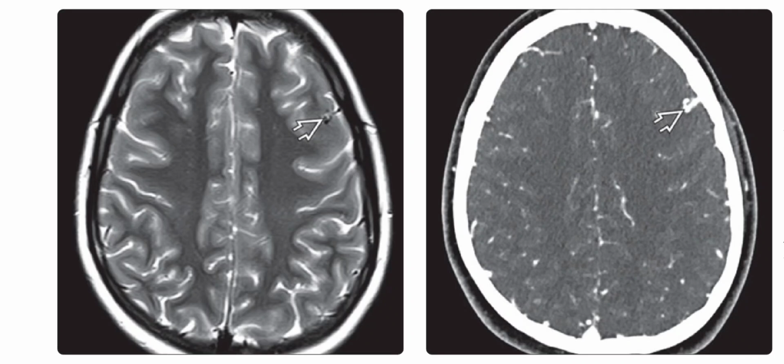Left is the axial T2 weighted MRI in a 16-year-old female with hereditary hemorrhagic telangiectasia type 1 who had a negative screening MRI at age 9 and is now showing a small, round and linear flow void in the left frontal lobe.